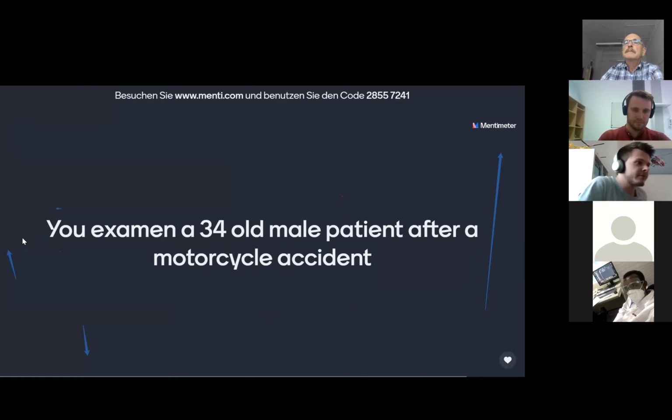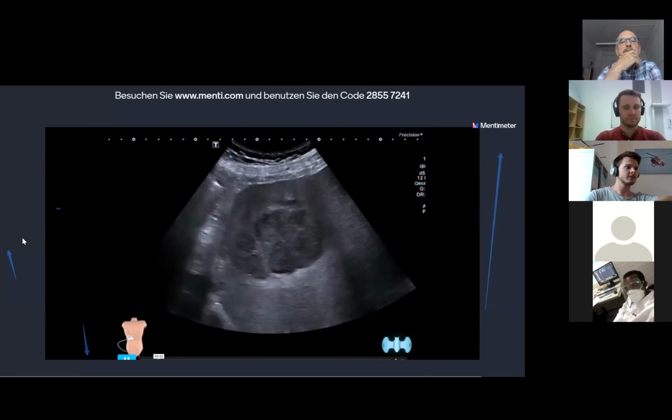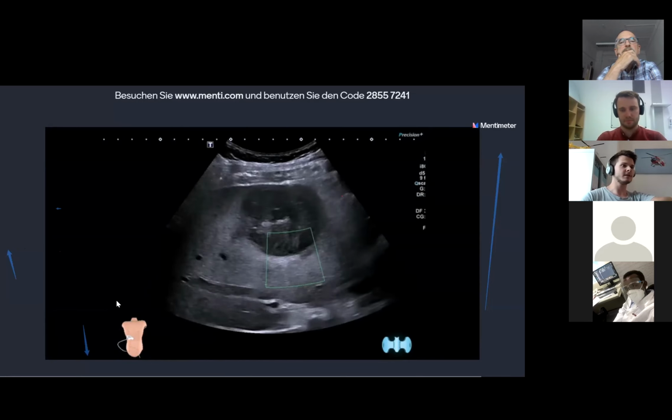And you also have your last patient on the day, and you examine a 34-year-old male patient after a motorcycle accident. And you also have an ultrasound loop here. You're also in the liver here, and you see this picture.